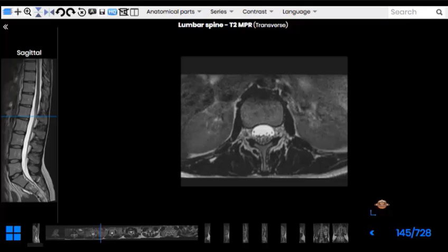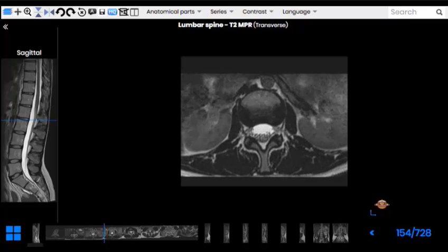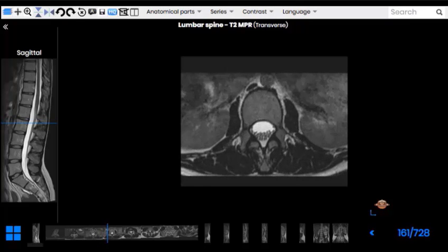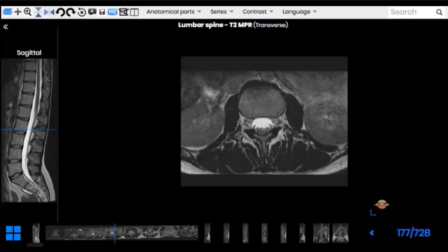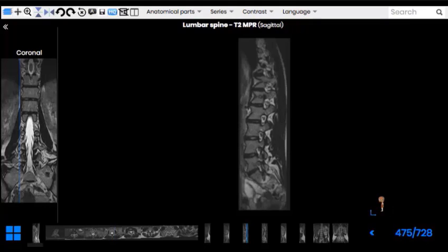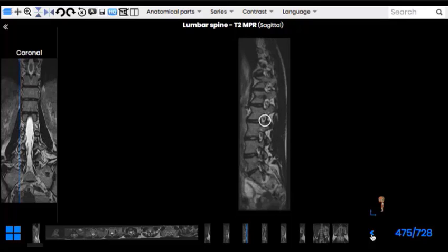And the next nerve, which is the closest one inside of the vertebral canal, this one is the traversing nerve L2, and it's going to leave the canal at the next intervertebral foramen right here. So one by one, these nerves leave. This is the L2 spinal nerve right here. So the size of the intervertebral foramina is important. It must provide enough space for our spinal nerves to exit the spinal canal. And you see some other dots inside of the intervertebral foramina, right? These dots are arteries and veins, the medullary arteries and veins which supply the spinal cord itself.